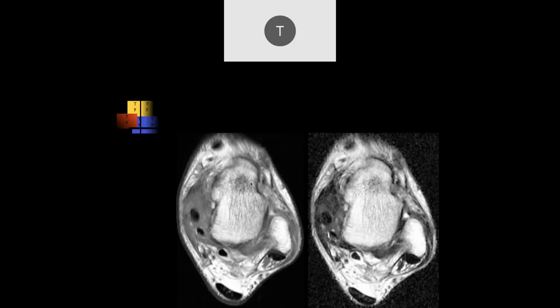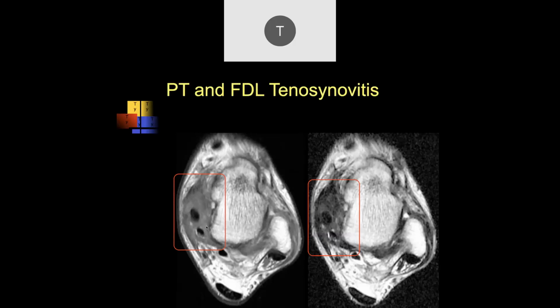All right, so it looks like we have a lot of soft tissue distension and thickening within the posterior tibialis and flexor digitorum sheath. Yeah, so this is the more chronic phase. Probably due to chronic inflammatory disease, you get a fibrous healing response, and you end up with marked fibrous thickening here. This is chronic tenosynovitis, chronic tendinopathy, and this is the kind that's often associated with the kind of instability we're going to talk about in the next lecture.